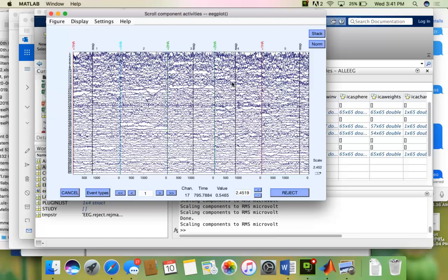If you're an electrical engineer and you have a little bit of background in signal processing, you understand that what we have really done is kind of boxcar truncate the data from when the stimulus appears until 2 seconds later. So we've taken a data set and it's discontinuous every 2 seconds. That actually can show up as a background in your Fourier spectrum.